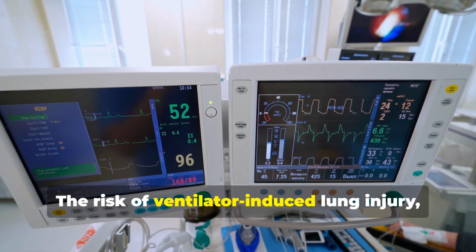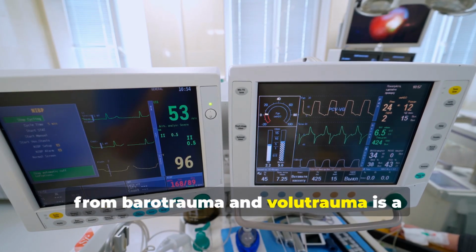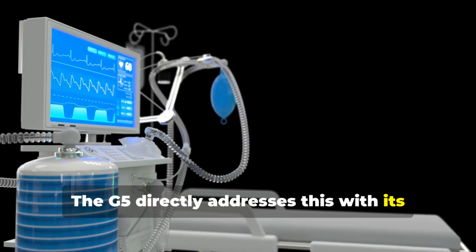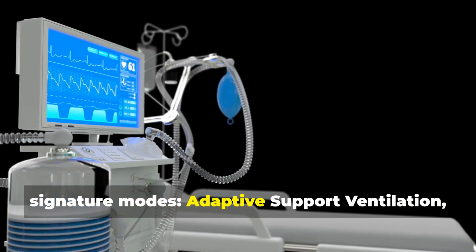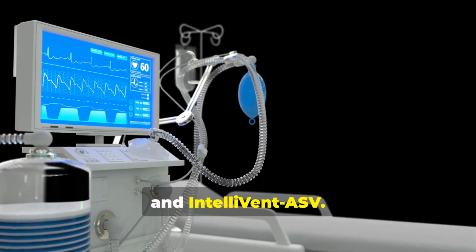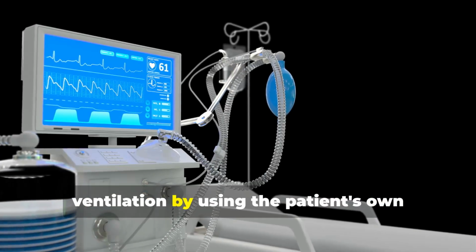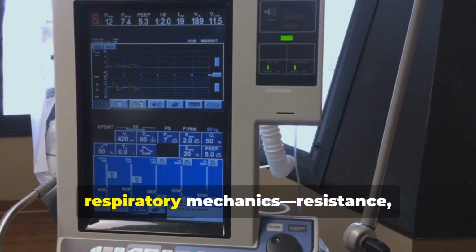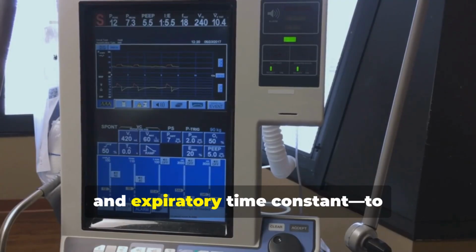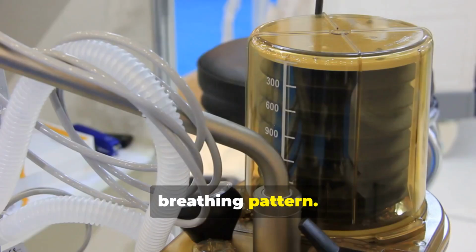The risk of ventilator-induced lung injury, or VILI, from barotrauma and volutrauma is a constant concern. The G5 directly addresses this with its signature modes: Adaptive Support Ventilation, or ASV, and IntelliVent ASV. These modes go beyond conventional ventilation by using the patient's own respiratory mechanics, resistance, compliance, and expiratory time constant, to calculate and deliver an optimal breathing pattern.